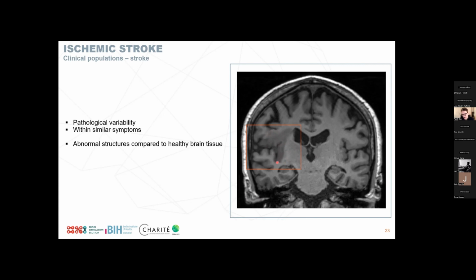Now, one of the main issues that we end up with is that we have dark gray areas where there should be just light gray. Right? So we have some intensity values that we usually find in the cortex and the gray matter area that are now represented in white matter.